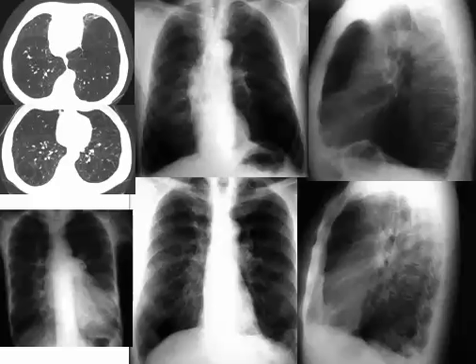But in emphysema they are hardly seen in both middle and outer thirds of the lung.